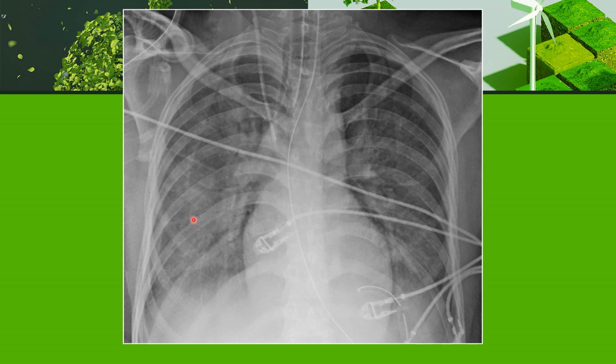It can happen in neurogenic pulmonary edema, a form of permeability and hydrostatic pressure edema. So the history is very important here. If the patient is non-cardiac and has no features of sepsis, and you see this picture in the X-ray, then you can label it as neurogenic pulmonary edema.